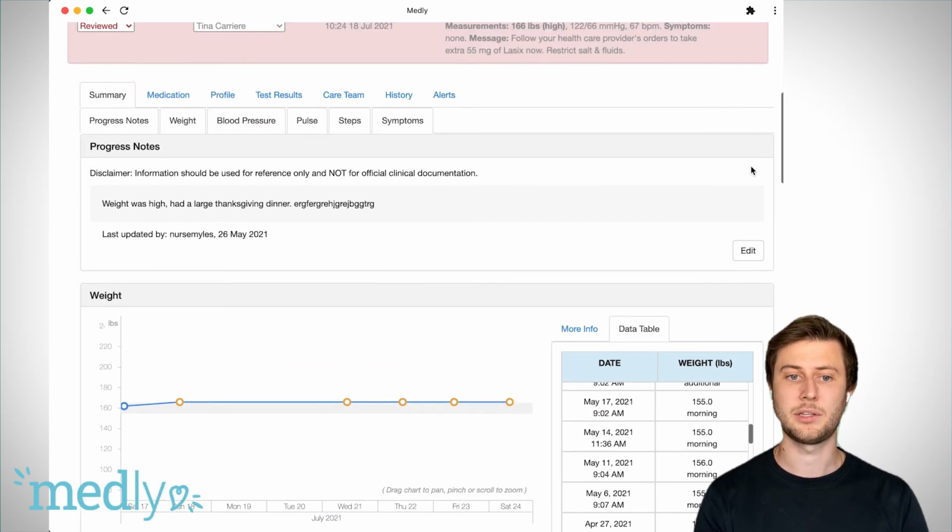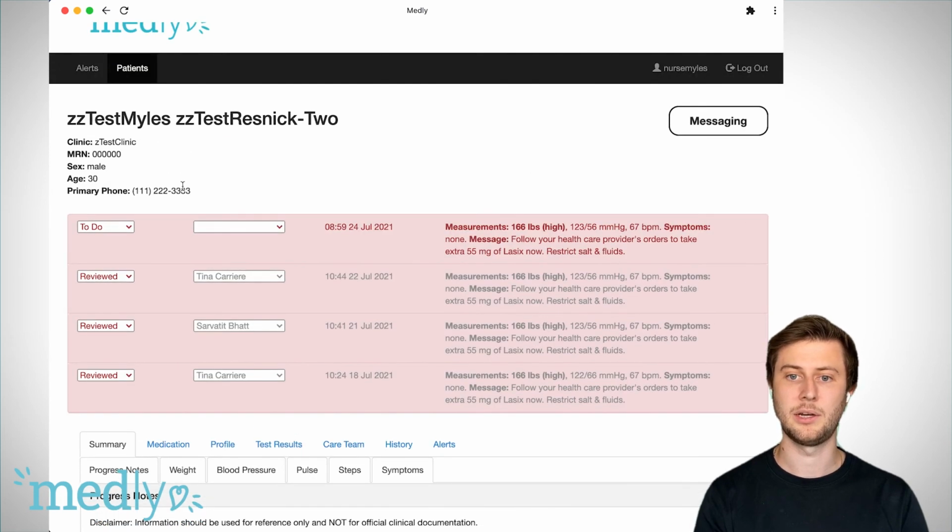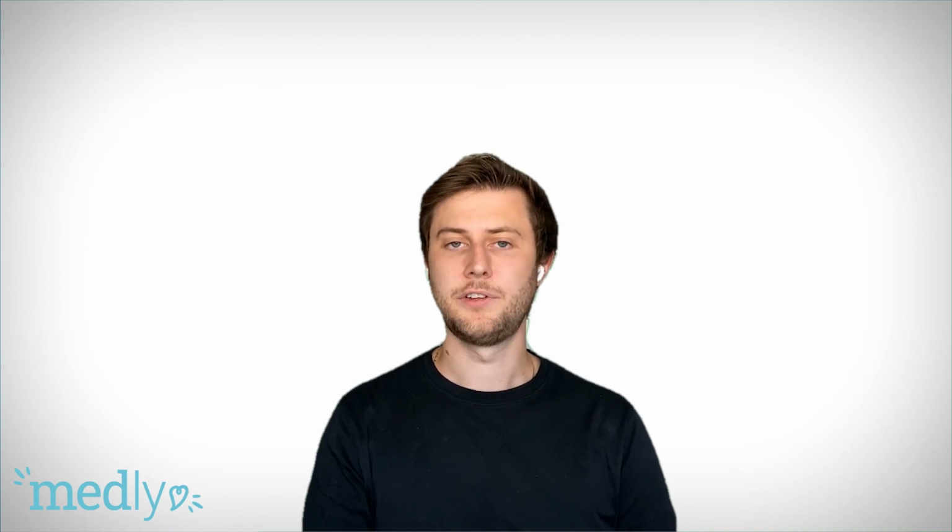For now, I'm going to mark that this patient has been okay. So I'm going to go in and mark this alert reviewed and continue on to the next one. That was a very high level overview of how Medly works from the patient and clinician sides of things.